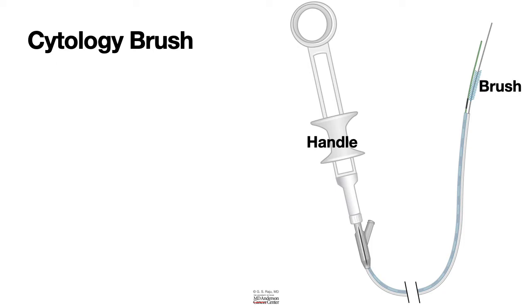So here is the brush, and the brush has a spring tip so that there is not going to be any damage as you open and close the brush. In addition, there is a guide wire port that allows us to pass the cytology brush over a guide wire.